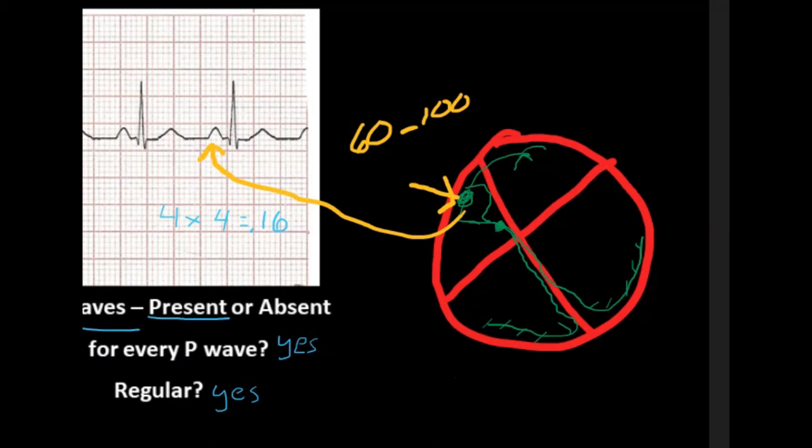So it's firing. We then know, and I'll just change colors here, we're then going to take all of this area right in through here. Okay, actually all the way down here to the AV junction, I should say. So all of this area is now going to be measured between the beginning of the P wave to the beginning of the QRS complex, right? So this is being measured right there. Okay, so we're measuring that PR interval. That is telling us how long it takes for that P wave to fire and be delayed at the AV junction before it is sent down to the ventricles.